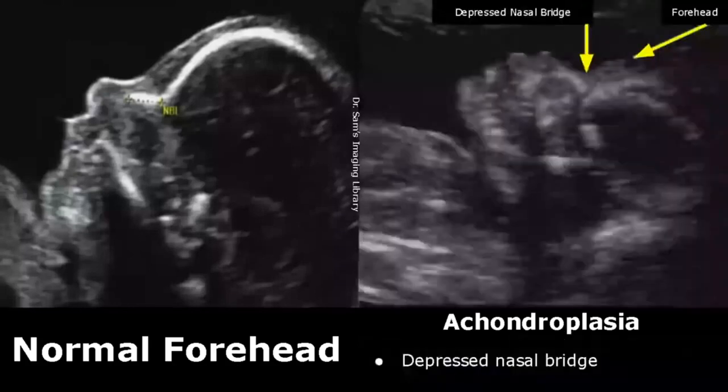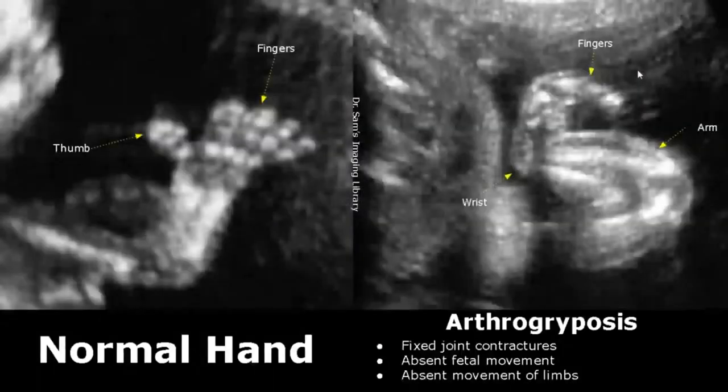In a depressed nasal bridge, the top part of the nose sinks deeper. It can also affect the forehead if it occurs. The forehead may also be depressed. Arthrogryposis involves fixed joint contractures with absent fetal movement.